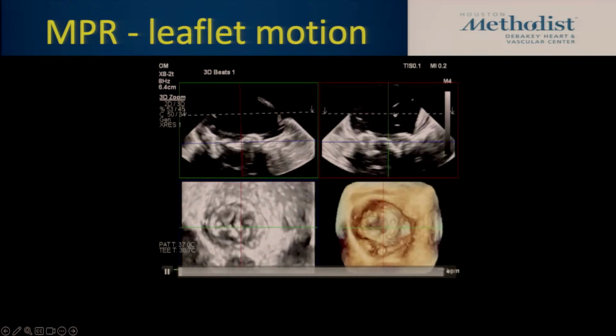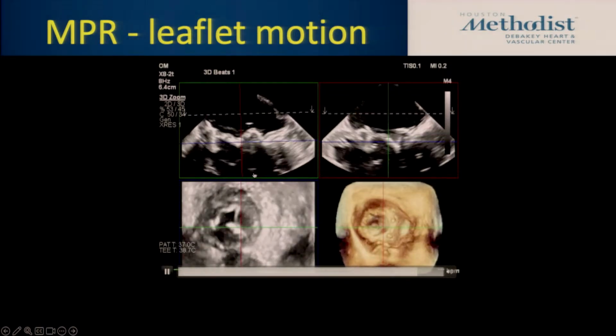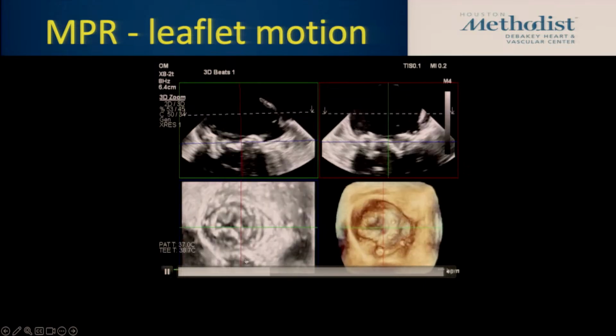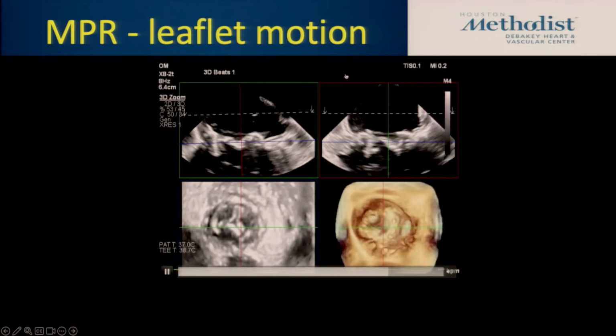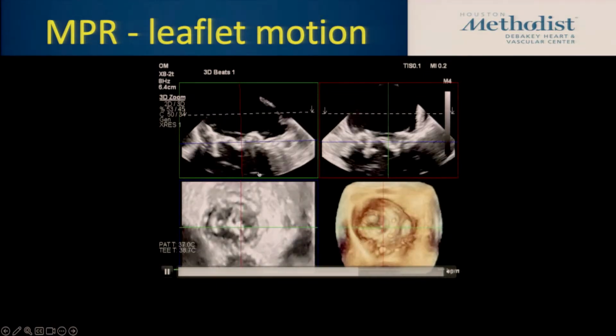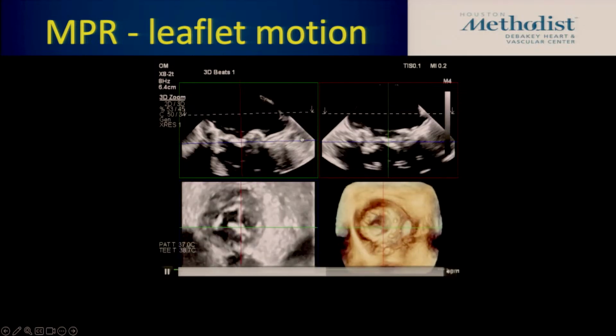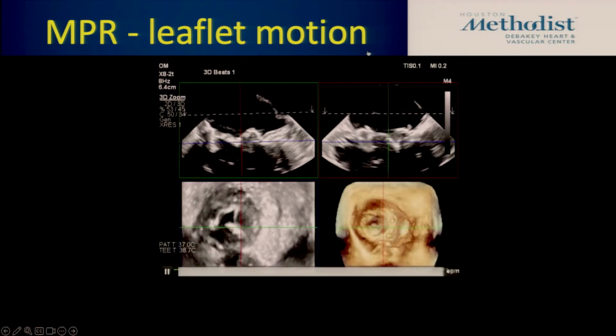So what we're learning, or the trajectory of the comfortability in this, is you have to recognize what the boxes represent. It never projects well, but you can see there's a green box here, which is created by this green cut line. This is a red box created by this line. And then this is actually the blue box, which is created by this line. So the lines don't show up very well. They should be thicker. You should be able to dial them up for display purposes. You can't yet. But this is important.